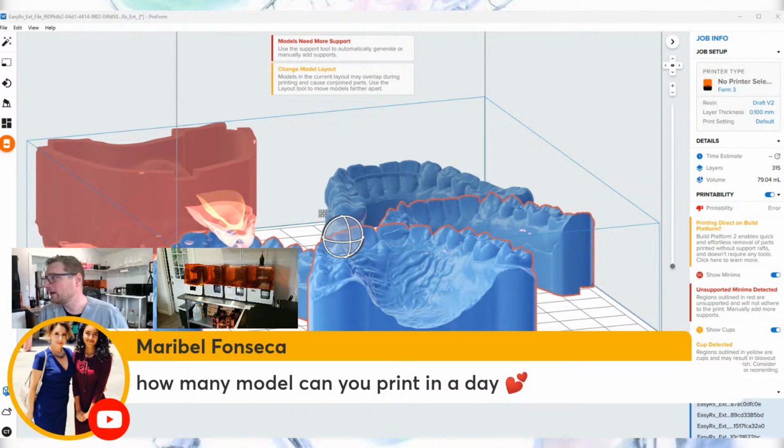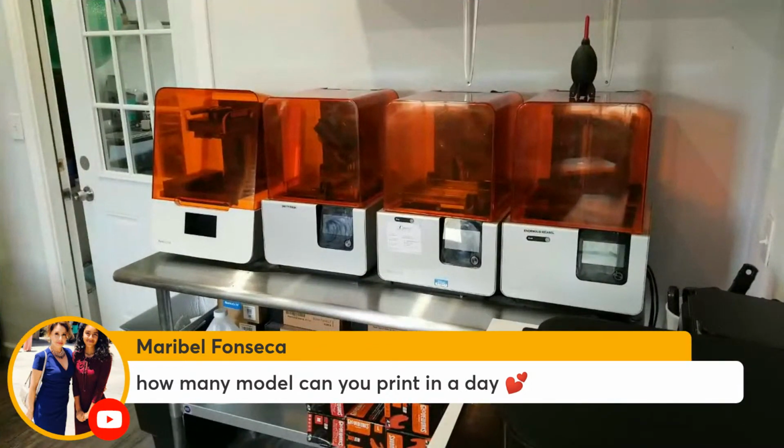Maribel, good question. How many models can you print in a day? So I do about 6 per printer. Okay, so if I go back to here, as you see on the printer, the far left one there, that's my Form 3. It's faster. I can probably print 6 in about 2 hours. The other 3, I only use the 2 in the middle. The one on the right, I've got to fix. I need to repair it. But the 2 in the middle, it's probably 3 or 4 hours to print 6 models.